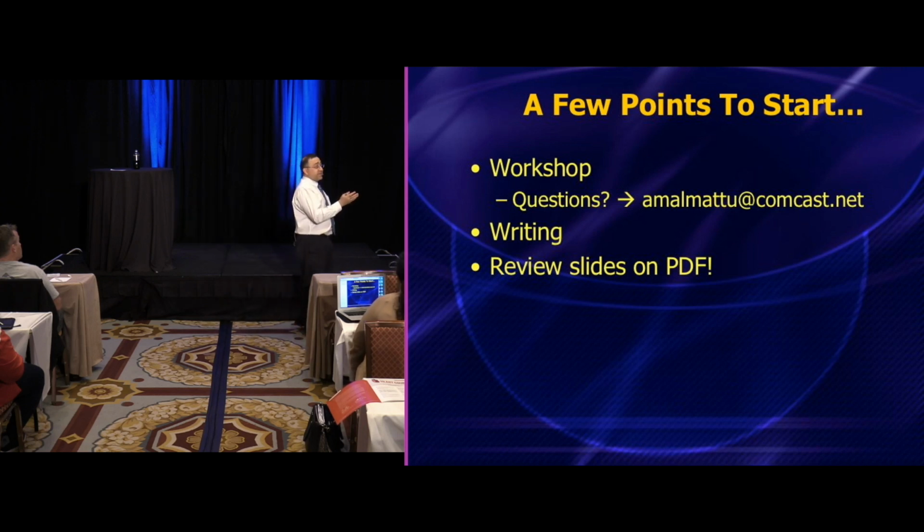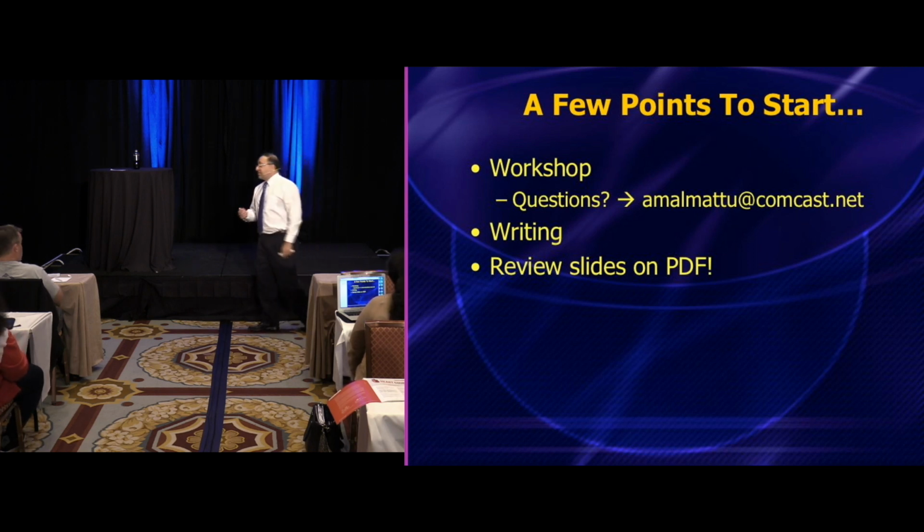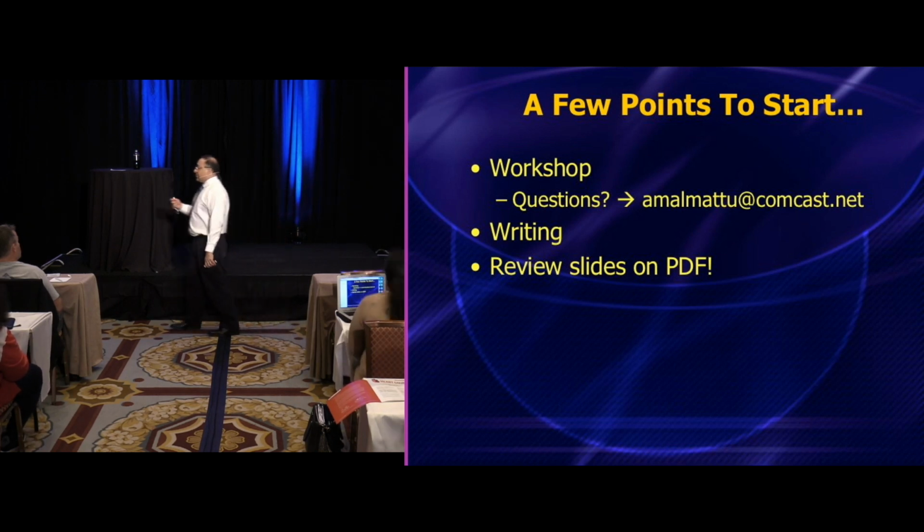In many ways, EKG is like dermatology in that what we find in real practice never looks like what they talk about in the books, right? And so you've got to see case after case after case to get good at this, and that's the way this workshop is set up. I'm going to show you a lot of cases of everything, but you still have to review this afterwards. And I encourage you to share these PDFs with your colleagues as well, all right?